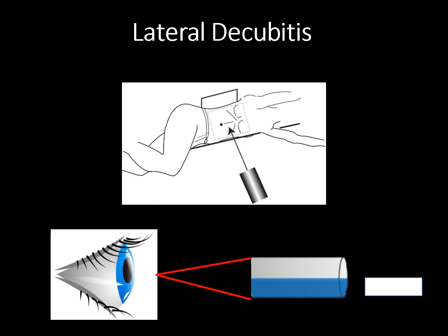If we look at our next view that we'll commonly see in an abdominal radiograph, we have our lateral decubitus. So the patient's laying on their side. They look kind of oblique in this diagram just because it's a little bit, I think, hard to illustrate. But really they're laying fully on their left side, and then you're going to shine the radiation through basically straight on through their abdomen with a detector behind them, but again with them fully on their left. So again, this cylinder is analogous to what would be going on in the patient's bowel if they're in that position.